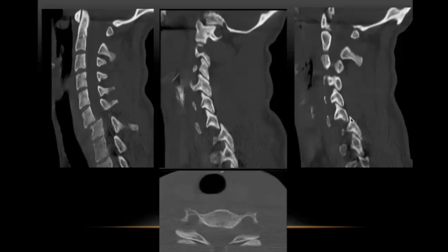Okay, this is lock. You imagine it's supposed to go satu macam tu. Tiba-tiba dia satu lari ke belakang. So yang ni tak boleh masuk ke depan lagi dah. It's already locked from here. Okay, and that's the axial view. This is called the hamburger sign, right? Reverse hamburger sign. Macam itulah.